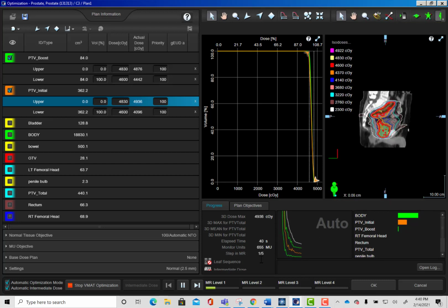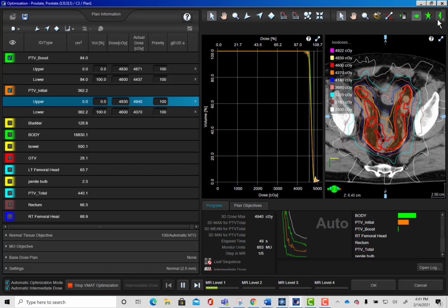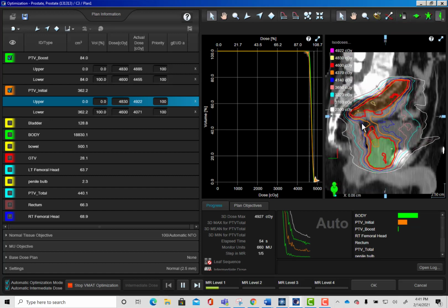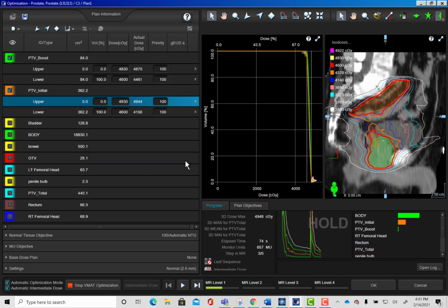Okay, I'm gonna let it get to step 3. I really like to look at all 3 of my views. For things like prostates, I especially like this sagittal view, just because I feel like you get a better idea. Our main priority for these cases, prostates in general, is the rectum and bladder. So in the sagittal view, you can really see if you're properly avoiding those structures, the whole length of those volumes. Okay, so in step 3, I only have my targets in here. Always a good idea to let this level out, but I'm just going to go ahead and get started.